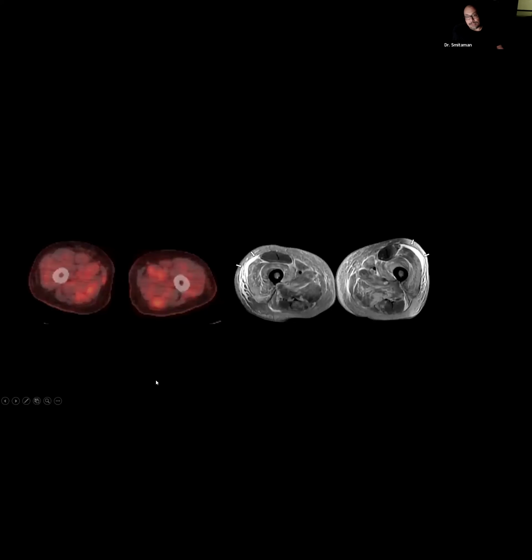Idiopathic inflammatory myopathies, as in this case here, PET on the left, MR on the right, STIR or T2 weighted sequences, are a group of autoimmune disorders that result in muscle weakness, inflammation, and it loves to involve the proximal extremity muscles, okay? These disorders, classically, depending on who you read, can be divided into 5 types, okay? There's dermatomyositis, polymyositis, juvenile myositis, myositis associated with cancer, and then myositis associated with connective tissue disease, or CTD, if I slip into shorthand, okay? So poly and dermatomyositis are the most common and well-known forms.